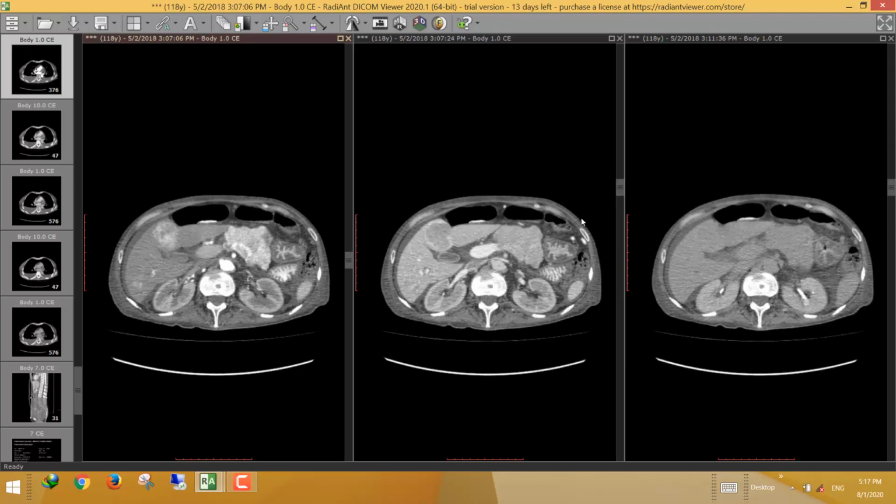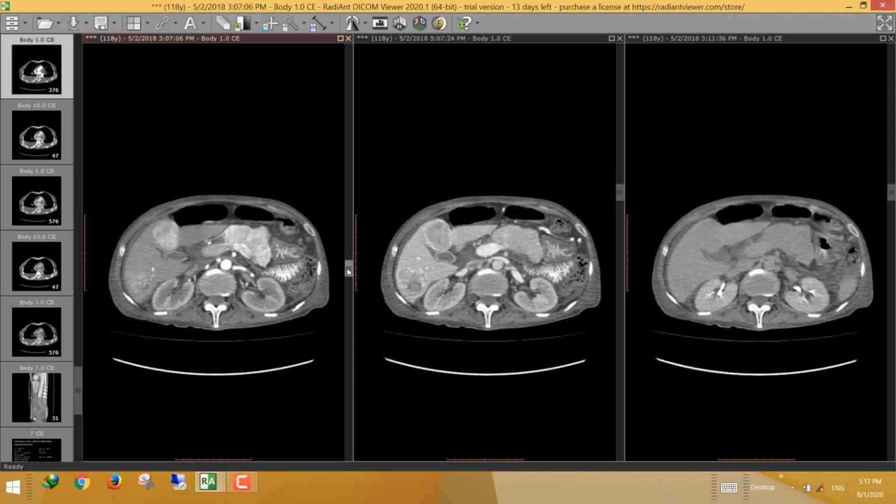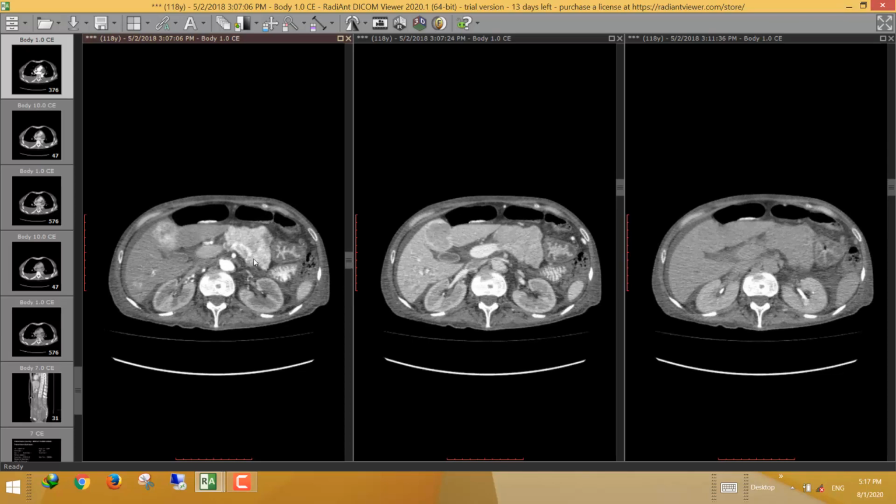This splenic vein is seen infiltrated by the mass lesion, and again this is one of the characteristic features of the pancreatic neuroendocrine tumor, that it infiltrates the surrounding vascular structures with intraluminal thrombosis. The thrombus is similar, showing the same pattern and same enhancement of the lesions.